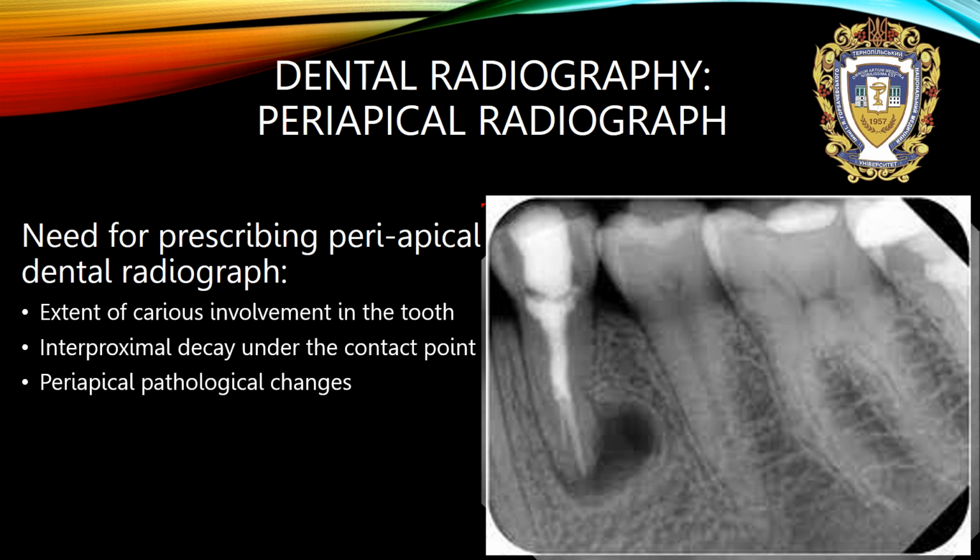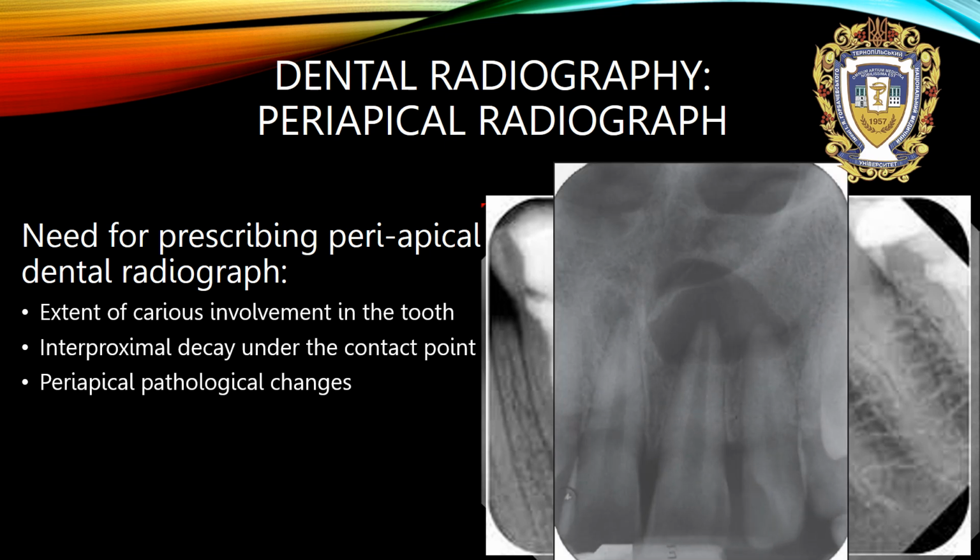Another X-ray. It is a typical cyst with clearly visible borders. Another periapical change is cyst 2. In this cyst the apices of two teeth are involved, tooth number 2-1 and tooth number 2-2.